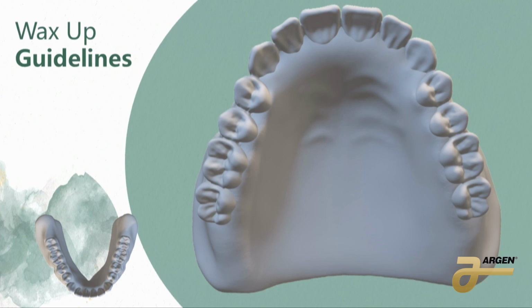This area here, you want this to be rounded, smooth. We don't want to have our wax carver, virtual wax carver, carving out a deep pocket because that's just going to build up debris and plaque, right? So we want it to be smooth, rounded, easy for our tongue to clean it, easy to wash it when we're eating and chewing.